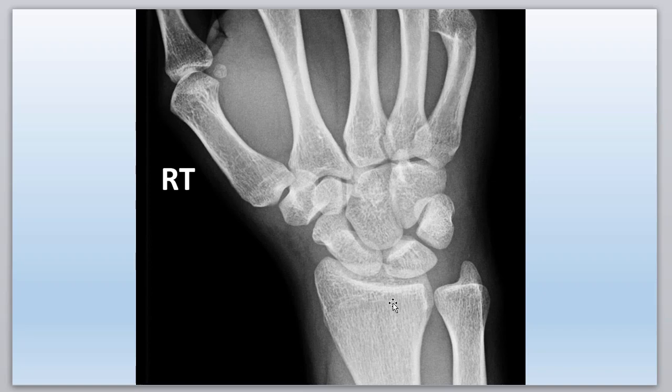So this is a young patient. You can still see the epiphyseal plate where it was. I'm not going to go into that. I'll wait till you get to your real radiology classes, but that gets more confusing because they look like fractures. So you have to learn what these growth plates look like. Uh-oh, I see something now. Let's check this. The lunate looks fine.